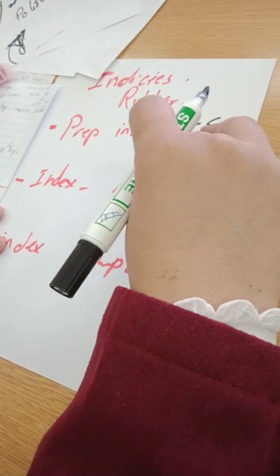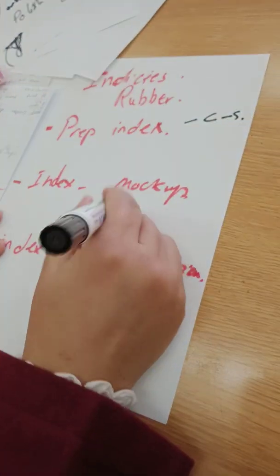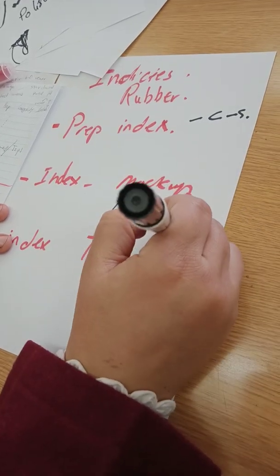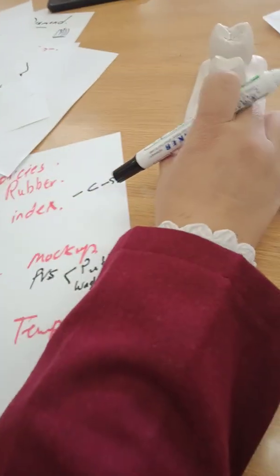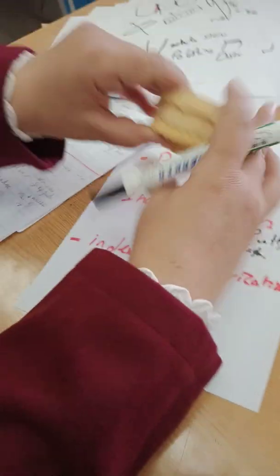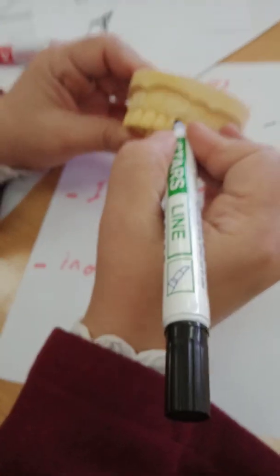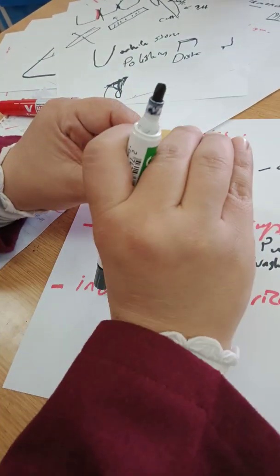Now what I see in a lot of videos, they are concentrating, whenever using a mock-up, not to use silicons, but rather using polyvinyl siloxane and even using it in putty and wash. So they place the wash around the marginal gingiva. Suppose these are the casts of anterior teeth, and suppose these are my prepared veneers. They will flow light body impression material around the gingival margins from the inside and the other side, and then come with the putty over it to become more accurate.